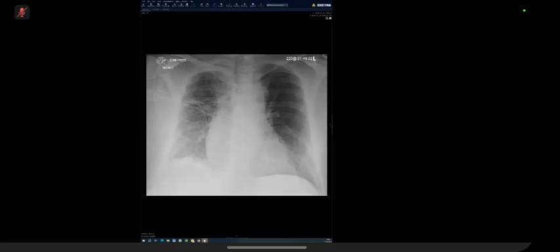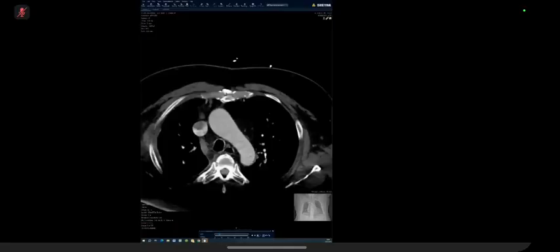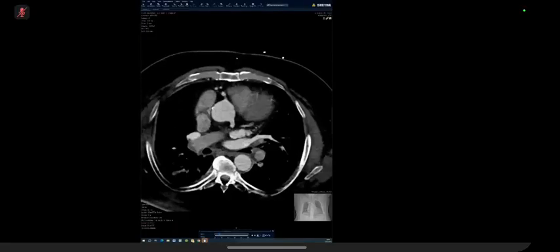So this one is a heart failure patient with a sternotomy. But what this patient has, he has an abnormal echo, and he is deteriorating quite quickly. He has a previous heart surgery for an aortic valve replacement. Let's see if you can spot the abnormality.